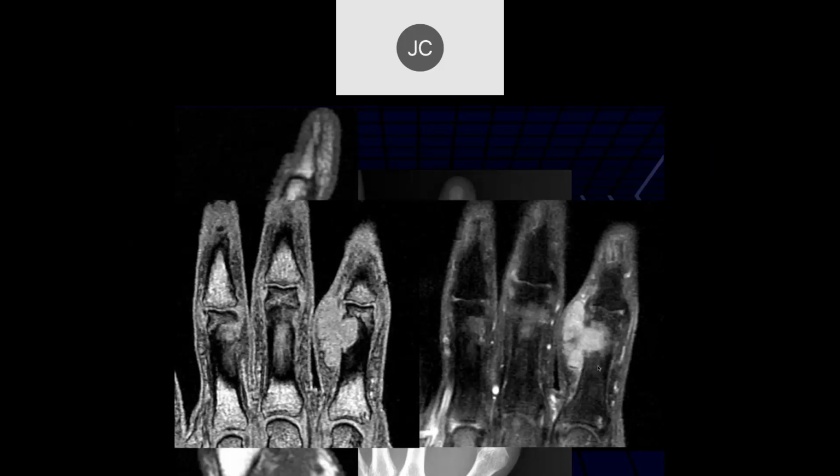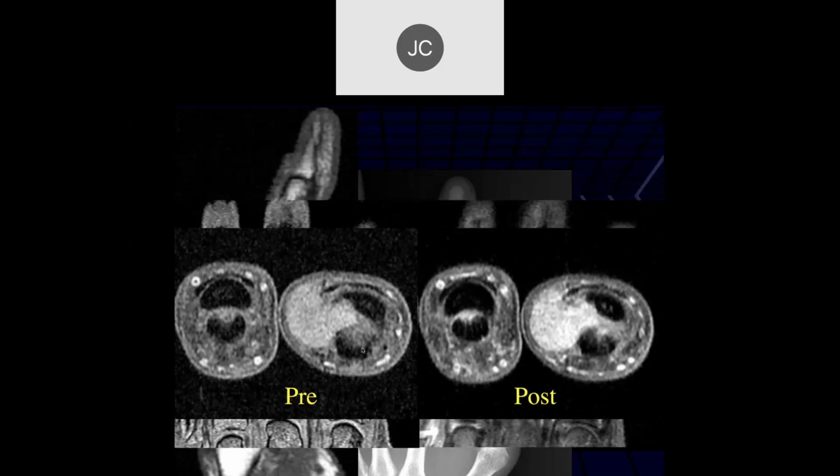Yeah, it definitely looks like gout again. I would certainly be concerned about gout. You have these sharp little margins. If this were a malignant tumor, you could have a mass within the bone that spills out into the soft tissues. But I've never seen or heard of a case where you get these spiculated bone margins. Neoplasm would just dissolve everything, destroy everything, and you'd have more rounded margins everywhere. So I agree with you. I think this is much more suspicious for gout, and this was gout.